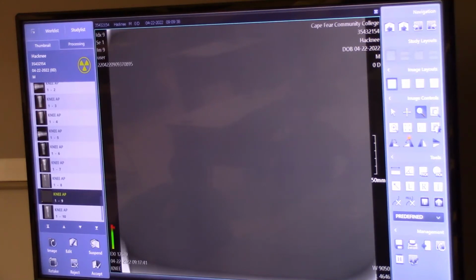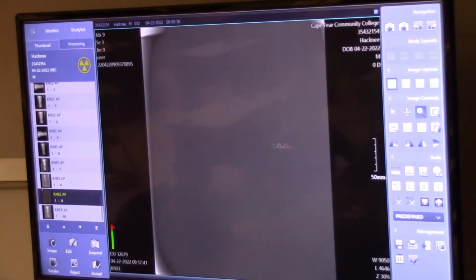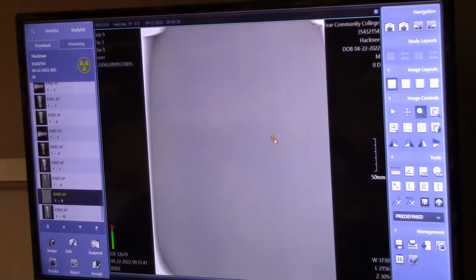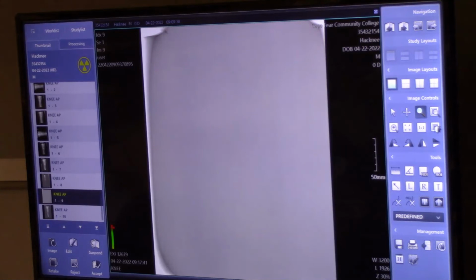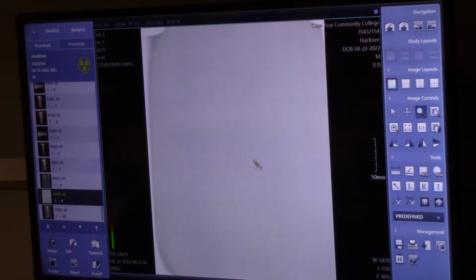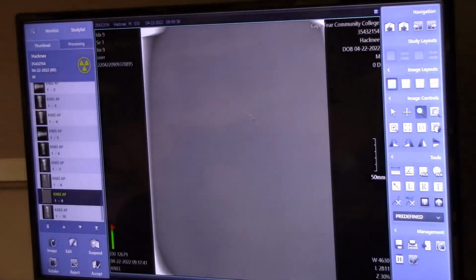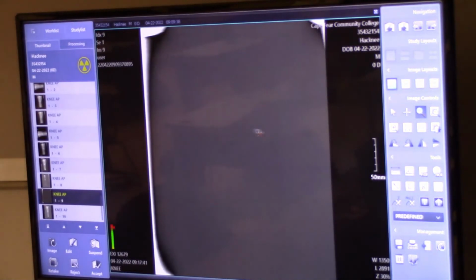All right, but here's what we're gonna do. Let's reorient it so that we're nice and straight. Much better. Okay. And now let's window level this thing. Okay, what's happened here is that every pixel, see this area here? Every pixel within this area has been burnt to the saturation point. In other words, they all have a grayscale value of 65,000. And so as far as the computer's concerned, there's no difference between any of these pixels. Therefore, no contrast. So the computer's got nothing to show us. We have managed to fry the entire plate.